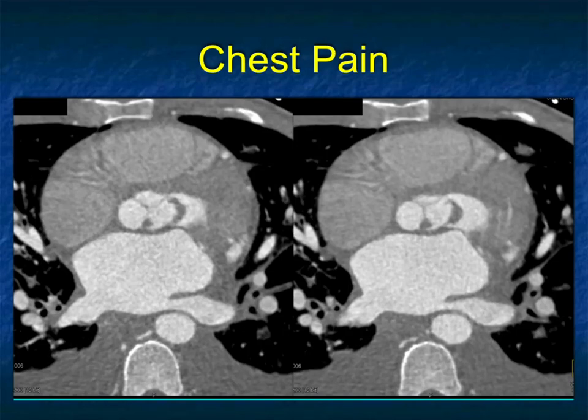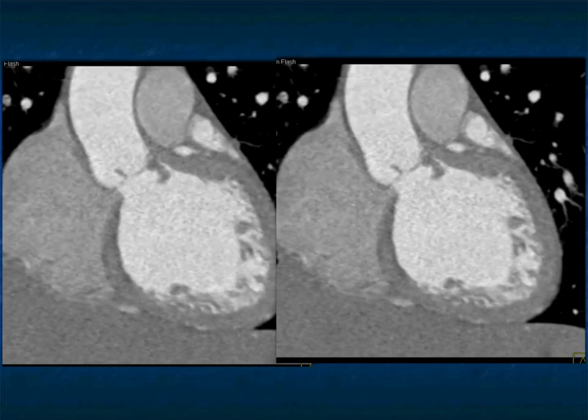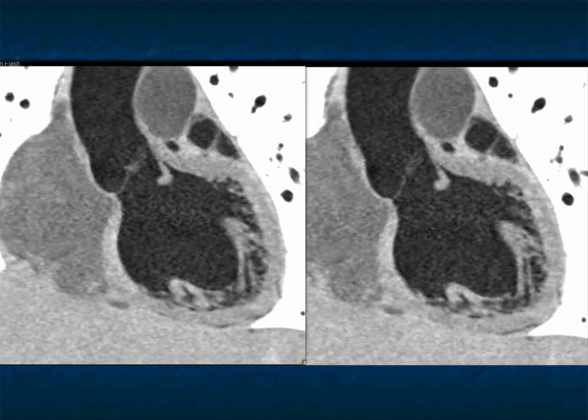Now, I mentioned before, what about thrombi? And here you're looking at this case and you say, what's going on here? You see the aortic valve, but there's something else here. There's some sort of mass, and what exactly am I dealing with? Here it is again, nicely shown, but you see, instead of projecting into the lumen of the aorta, it's projecting posteriorly off the valve into the patient's left ventricle. And that's more of a common appearance for a patient with a thrombus. Here you can see it very nicely.